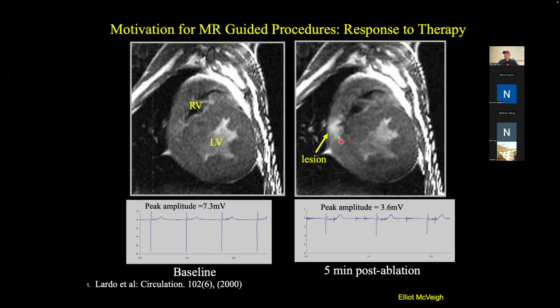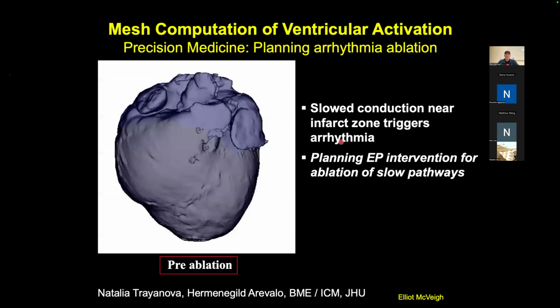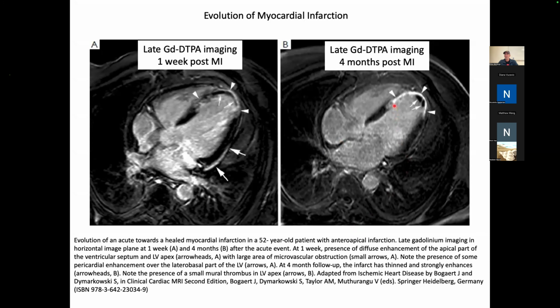But from a research standpoint, all the major players, Harvard and Hopkins, we had 2 labs at the NIH and things like that. And so it showed really great promise, but a little tough to get into actually for your average clinician. We looked at that. But what I wanted to show you was if you can image this infarct, and so you make a really nice picture of it. We tried for years to make super high resolution pictures of these things, but we couldn't get the heart to stay in the same position at sort of 0.5 millimeter resolution. So you hit a limit to the resolution.